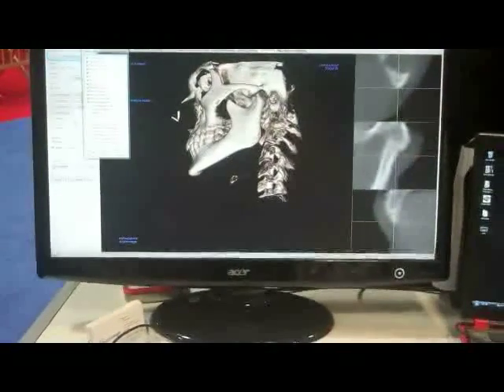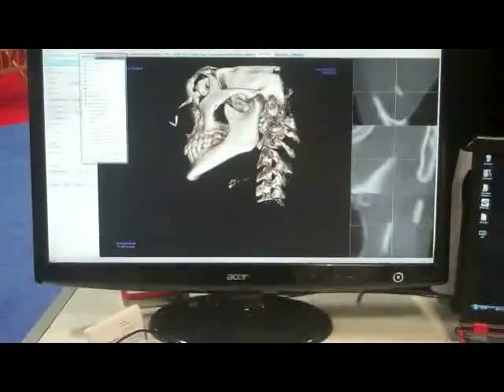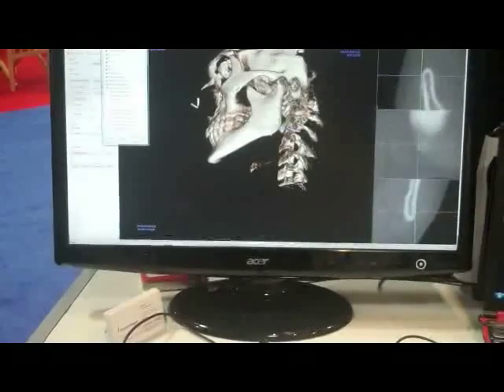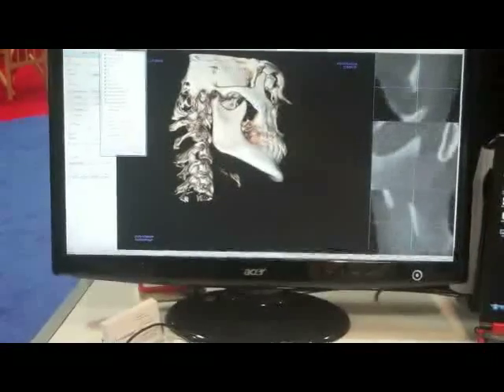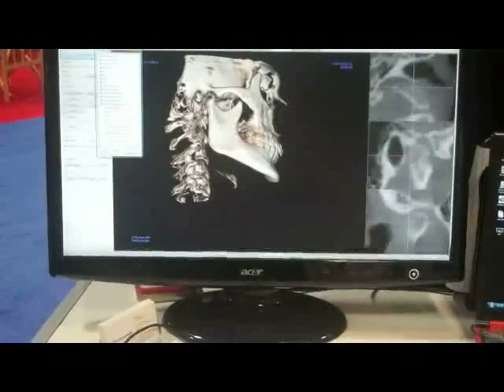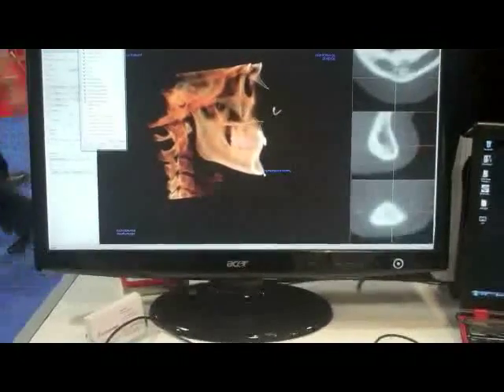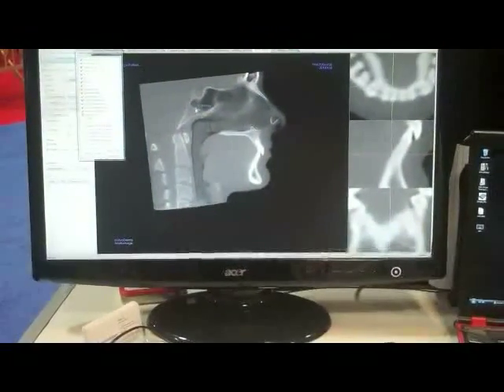So now we're going to do the Mandibular Profile. I'm going to do the whole coronoid process here as well. Top of the condyle back there. Right click, move on to the next one here. So we can do this tracing in about 2 minutes or so. This is really set up for speed and accuracy. Symphyseal here. Move on to the next one. Cephalometric Profile.